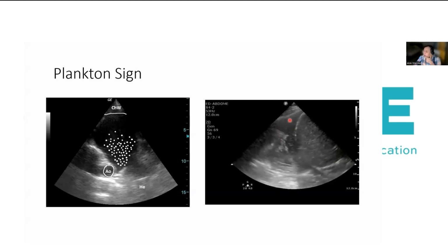Now, if you had a CRP of about 200 with a baby that's febrile and toxic, and you aspirated and you got fluid that looks pus-like, then really it would not be surprising if you saw this kind of ultrasound appearance. You can see a similar ultrasound appearance again if you have a very high hemorrhagic kind of pleural effusion, and these could actually be RBCs as well.